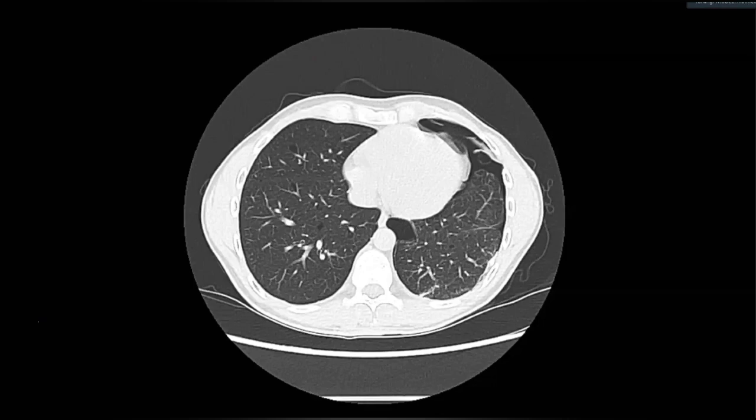So this is not like a LAM. This is not lymphangioleiomyomatosis. The cysts are usually round, very well defined. Yeah, but as you're telling about the angiomyolipomas, they are associated with tuberous sclerosis. No, I'm telling you about renal lesions. I never said angiomyolipomas. I told you renal lesions. This patient had a prior surgery for renal cell carcinoma, and he also has skin lesions. Anything that comes to your mind?